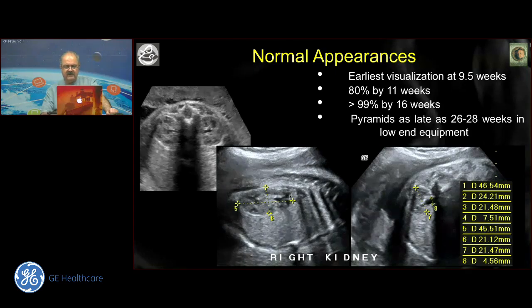We will come to measurements later, but there's a good illustration here that, truly speaking, the important measurement is the anteroposterior diameter of the renal pelvis in an axial section. We put the plus points on the white portion of the actual renal pelvis wall, then measure the distance between them, and mention it in the report.